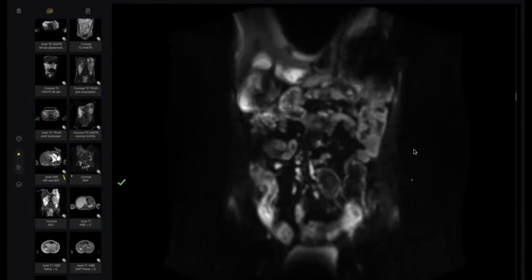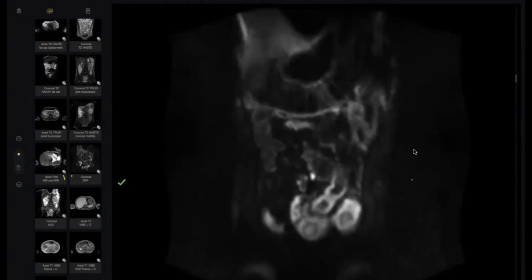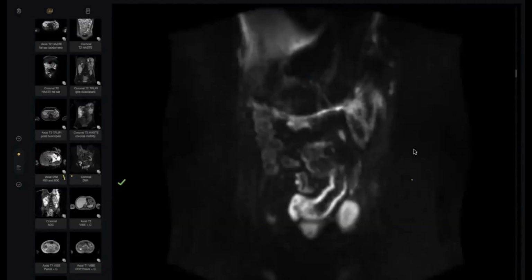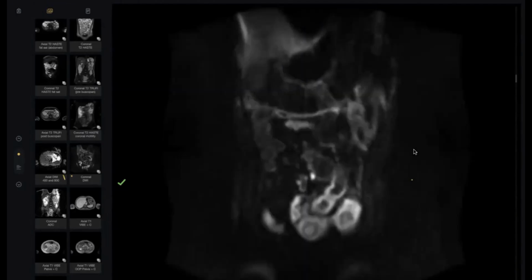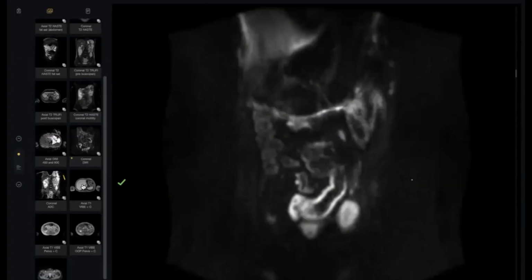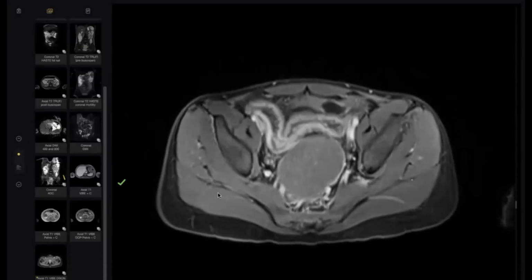Yes, the restricted diffusion shows that this is active inflammation. I will look for other complications in the study, to rule out any fistula formation or abscess formation. Is this a long segment or short segment? This is a long segment. Is this a skipped lesion or not? Yes, skipped lesion. I can appreciate other lesions as well in the mid abdomen, ileal loops.